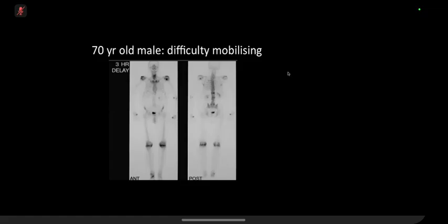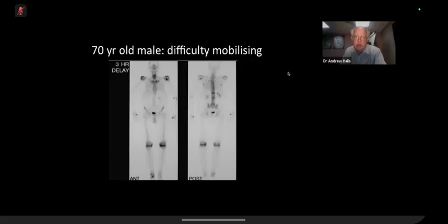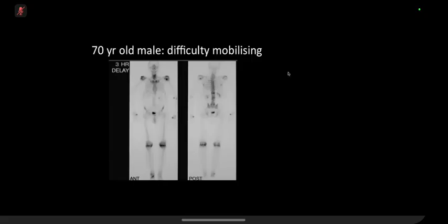So they've got arthritis in the knee joints. Yes. And in the shoulder joints as well, but predominantly the knee joints. We've lost the disc space. We've lost the joint spaces in the weight-bearing joints.